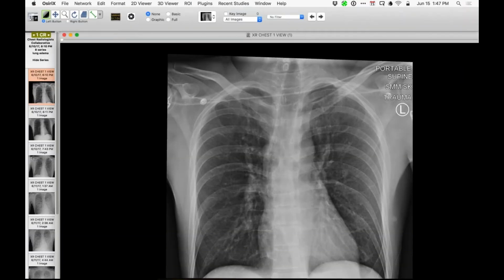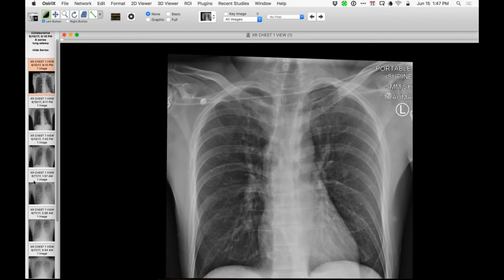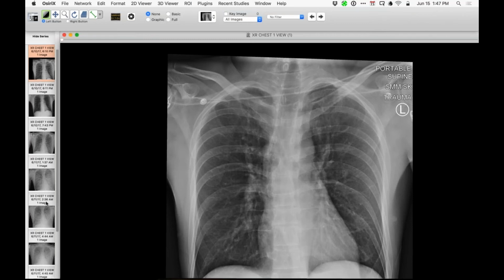And this is interesting because I think it's another case of what I showed a couple of weeks ago, equally dramatic, of what definitely in the previous case was lung edema in the context of air embolism during the performance of a neurosurgical procedure. And this one is interesting because I think it's another one, which is things sometimes just happen that way.